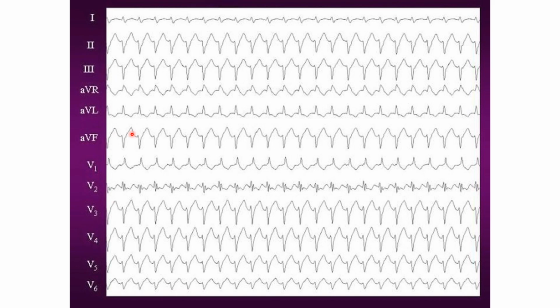Anyway, a wide QRS tachycardia, until proved otherwise, is considered to be ventricular tachycardia. In this case, there are two specific features you have seen. One is left axis deviation, suggestive of left anterior hemiblock pattern. Second is a right bundle branch block pattern. So when you have these two together in a ventricular tachycardia, one specific entity is known as posterior fascicular tachycardia, also known as Belhassen's tachycardia.